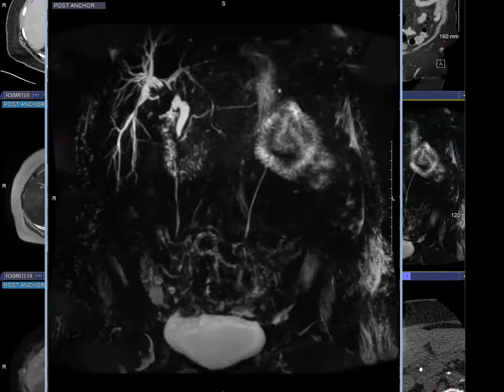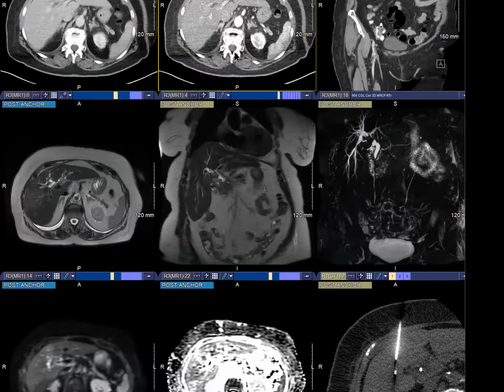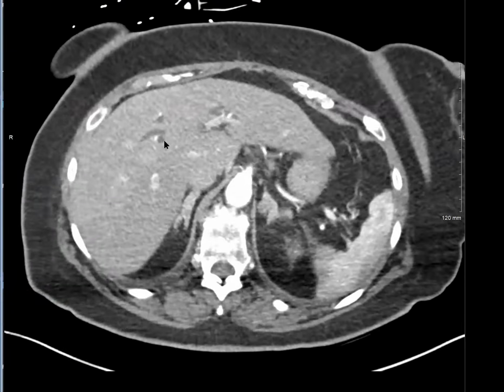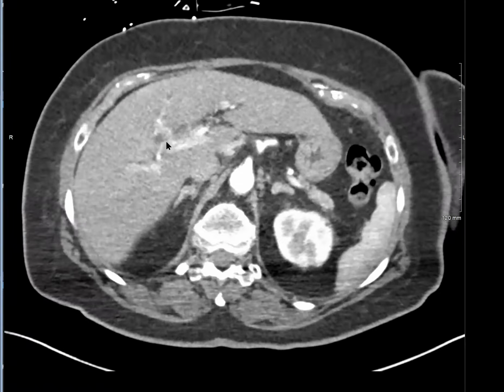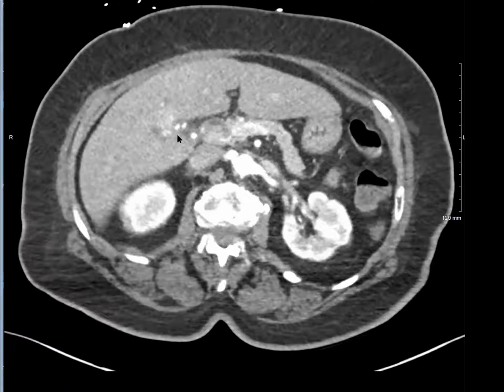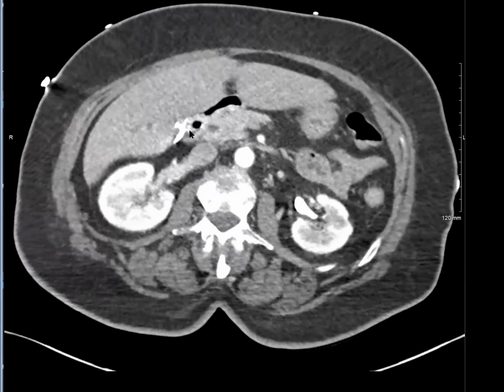we did repeat imaging. Imaging continued to show, let me show you. She was stented, but the imaging was not very different from what we saw initially. So I'm just going to show you the initial images. Now, if we go back and look carefully at the pre-stented imaging, that was her initial one, scrolling through, like you rightly said, I think that was you, Nelly, correct? For the soft tissue thing? Yeah, it looks like an intrahepatic papillary lesion.